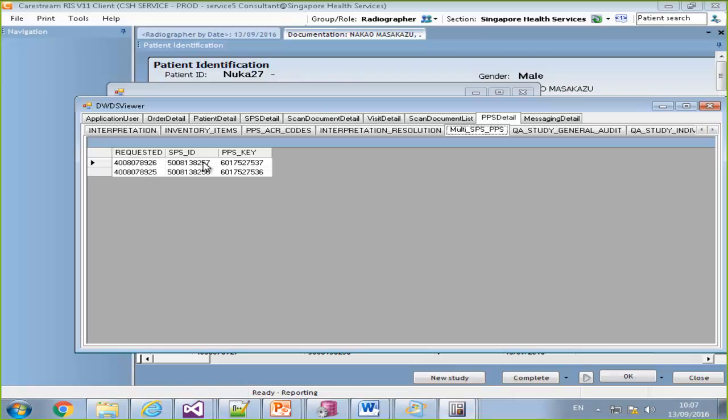Fields that no matter what we are putting in the data window, we're never copying them. It would be the PPS key or the accession number or this kind of procedure. Everything is documented in the documentation. But all site tables or customized fields, whatever, everything is controllable, and you can change the skip copy if you want to add them. If not, all the configurable site tables are copied from one PPS to the other. All the data set container is copied. PPS instance UID, the fields that you basically don't want to copy.